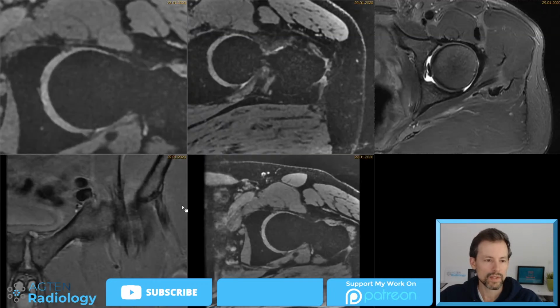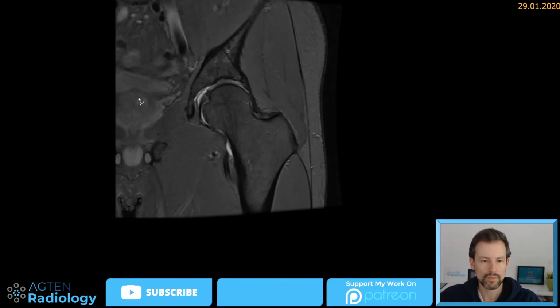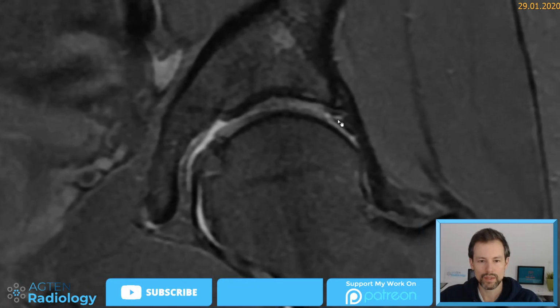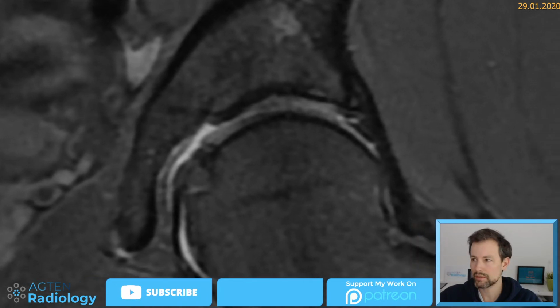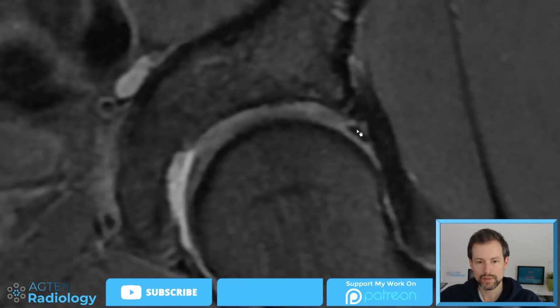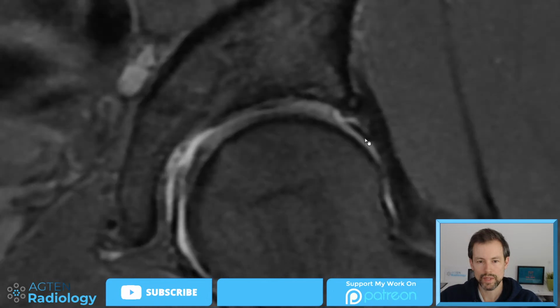And we know, just based on experience and statistics, that these kinds of lesions will probably occur in the anterior superior region. And this is now laterally, and we can start to see here at the base of the labrum some hyperintense signal changes. Yeah, you can see this. There is even signal change into the labrum substance. Here, it's too bright, and here, this one here. So this kind of fluid also undermines the cartilage a little bit, and this is consistent with chondrolabral damage and/or separation as they described in the surgical report here. So this is certainly what they saw.